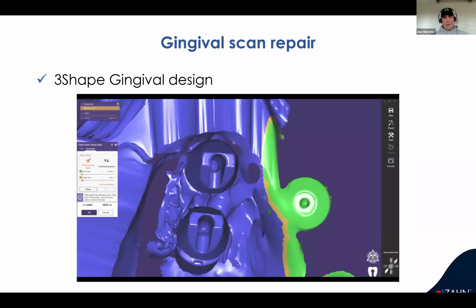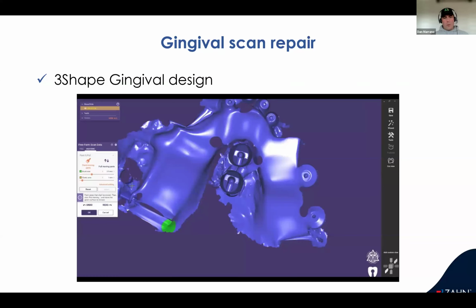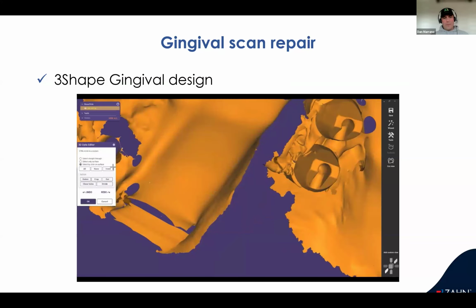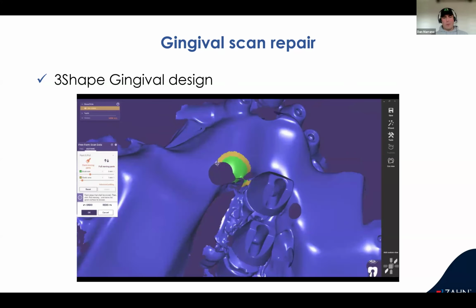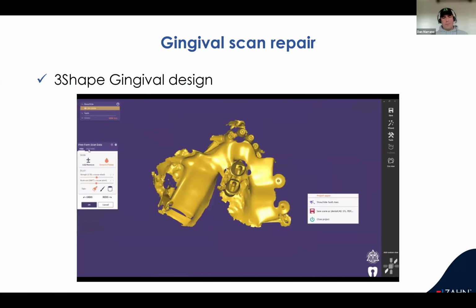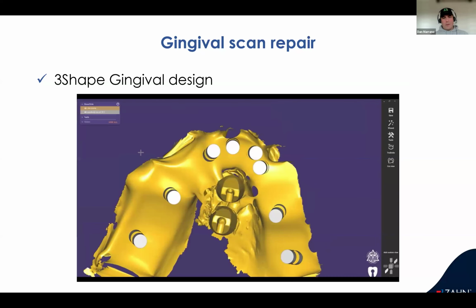Smooth canvas. I'm going to use the paint and pull tool, and smooth the whole thing out. It doesn't matter what that tissue looks like. We're not even using it for the surgery anyways, because he didn't even suture to show us where the tissue was. We're just going to get ourselves a nice clean spot.